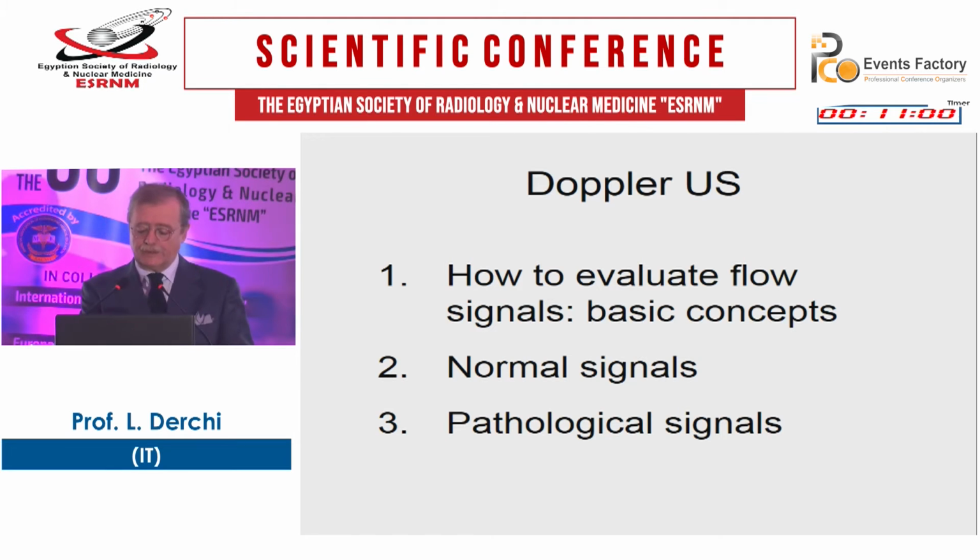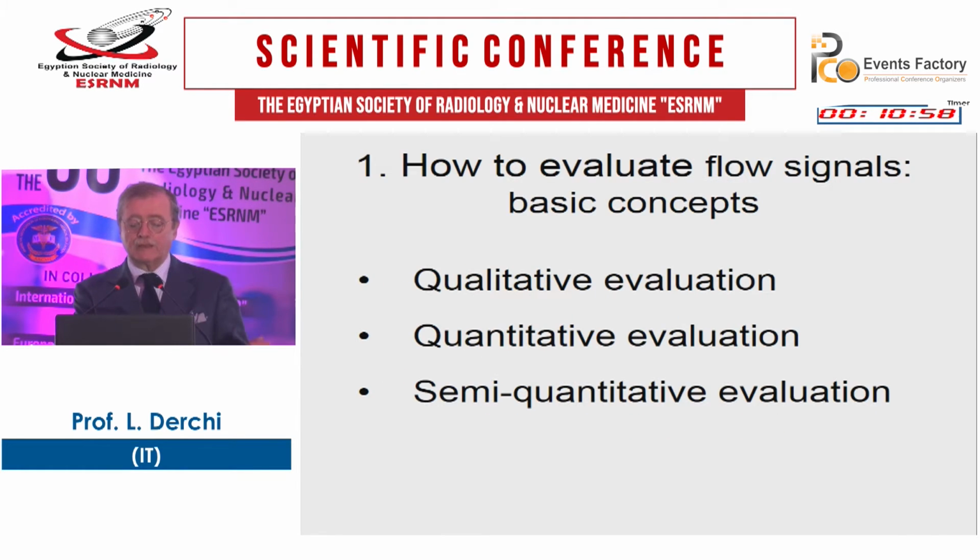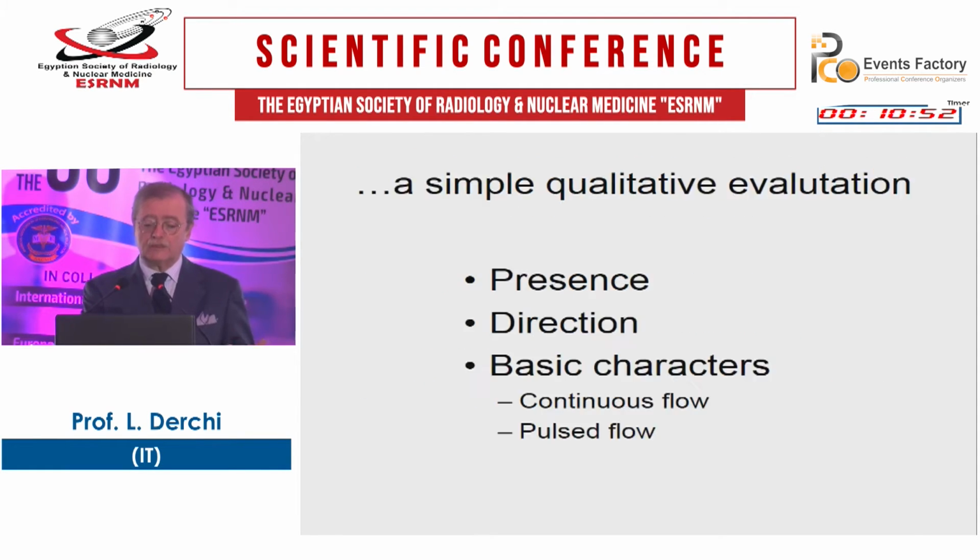But how to evaluate? We evaluate in a qualitative way, in a quantitative way, and a semi-quantitative way. And qualitatively, we can say there is flow, which is its direction, and which are its basic characters. Is it continuous or pulsed?